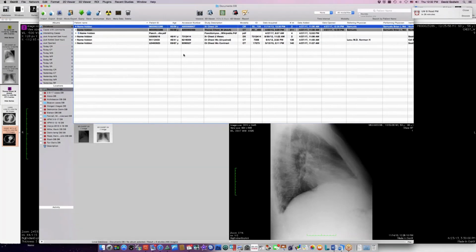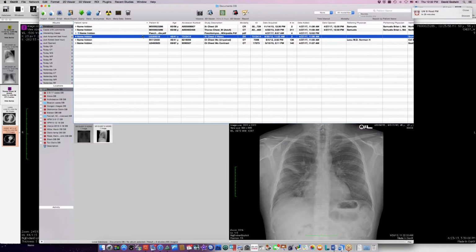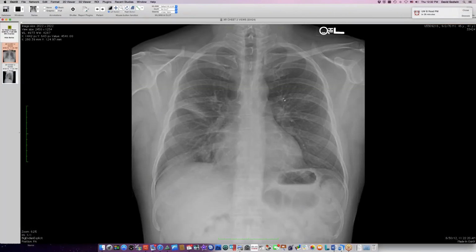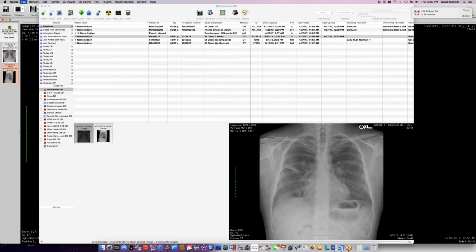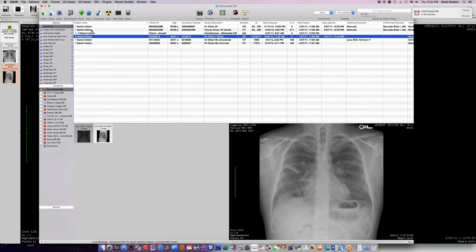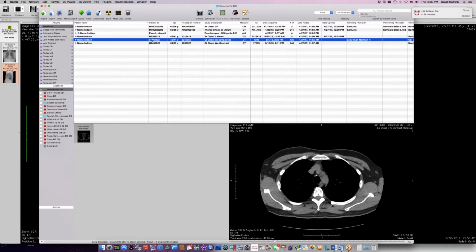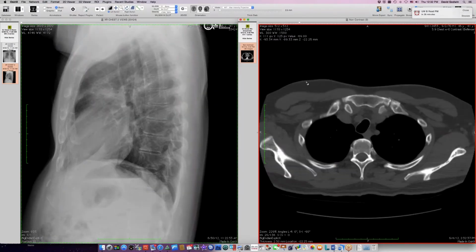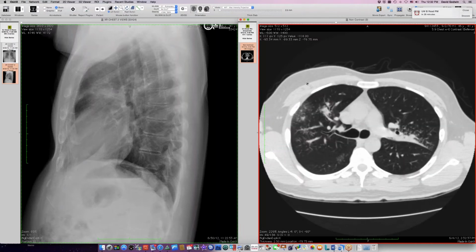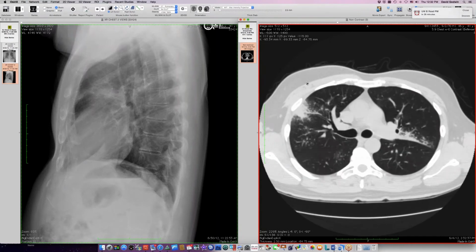So this is my second in a week of incidental silicosis. Let me show you this case, to a lesser extent here in the left upper lobe, and a little deposit down here as well. And he has this CT scan. I think this is he. So this is his CT scan, and it shows these interesting collections of what appear to be small nodules that are conglomerating together.